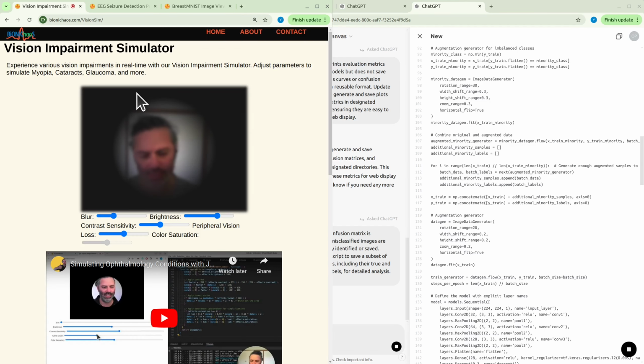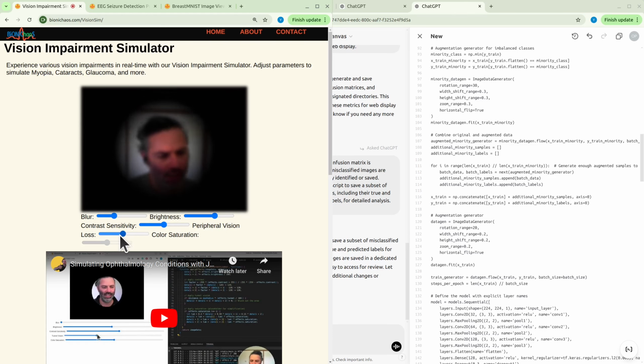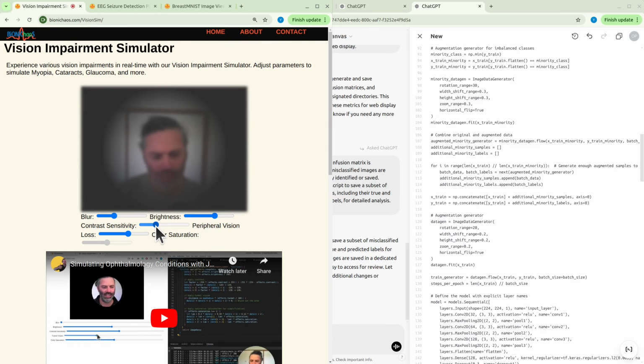Yeah, this impairment simulator, I can actually hear my CPU, GPU going. It's a bit too heavy, especially when I'm making changes on the page. I think it must be the GPU then. I don't know if there's interest, we might look into redoing it from scratch.